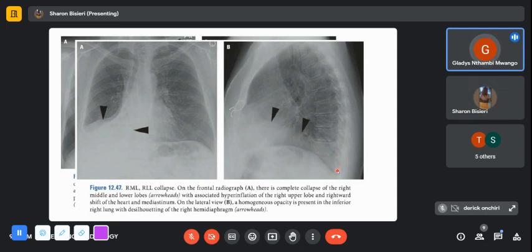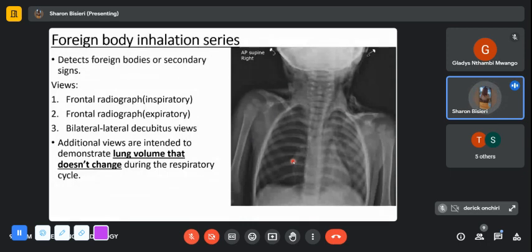It's complete, as opposed to the left, which will be associated with the gastric bubble, and it stops just where it reaches the heart. It's not usually complete. So again, that also confirms to you that you have a right lobar collapse. Yes. And then the opacification overlying the heart tells you the middle lobe is involved. All right. Thank you.